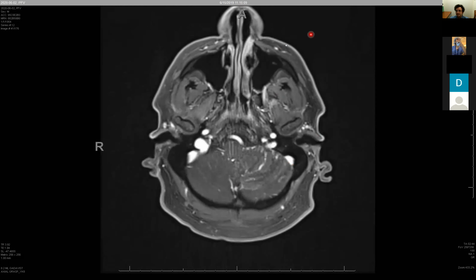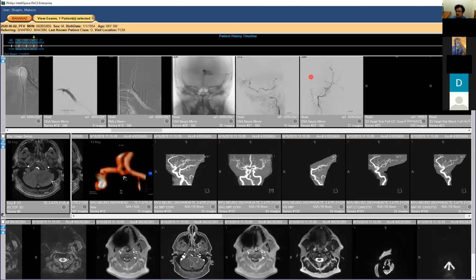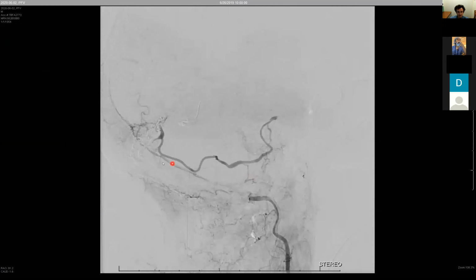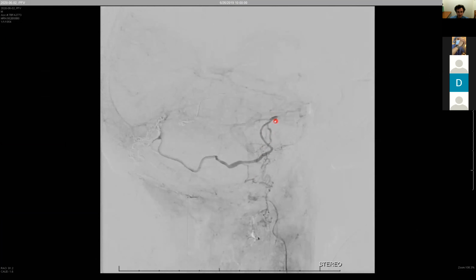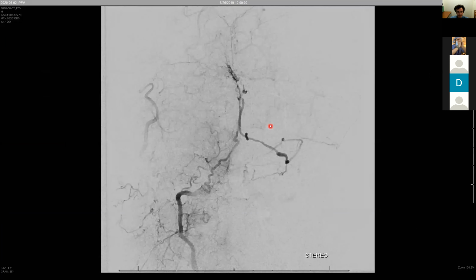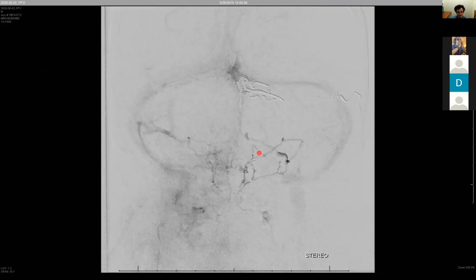I hope this still works. So going back to this, here's the lateral view of that. As we were saying, it comes to the petrosal group, but then it doesn't find the usual outflow that you would need. Instead, it's coming into these lateral brainstem veins. There's the frontal view of that. These are all around the brainstem.